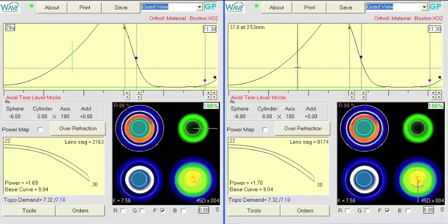and then, not very exact, but maybe 3.2 millimeters inferiorly. So at 7.2, it's a total diameter there of 7.2 millimeters.